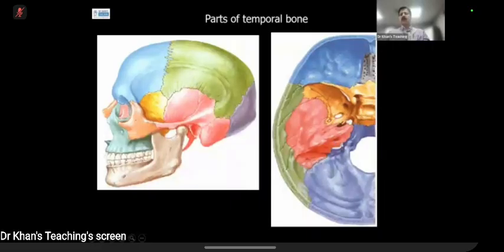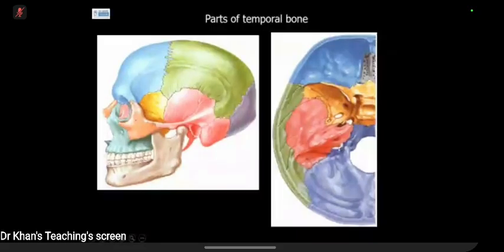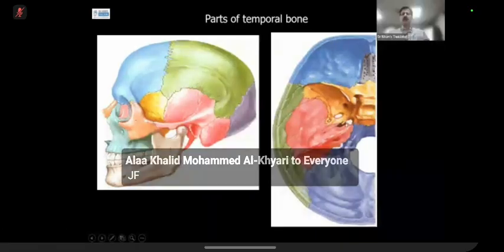Now, candidate 1, what is this foramen? That one below the lacerum. So lacerum was here. Yes, lacerum. And nothing of interest passes through, as I was telling you. In a cadaver, it looks like this. Otherwise, for us, there is nothing important passing through it.